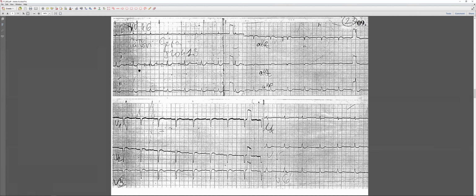So here I don't see. Maybe R is problematic. aVL I don't see. aVF I don't see. V1 I see. Also V2, V3. And I don't see any ST elevation or something. So it probably should be an old anterior MI.